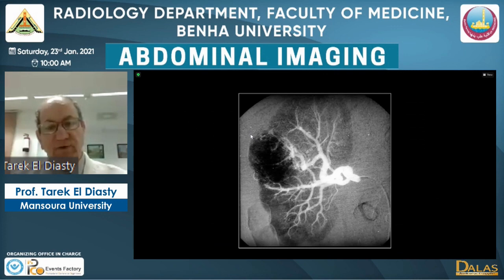And the other indication for selective renal angiography as a diagnostic tool is to make it preoperatively for the possibility of nephron-sparing surgery or partial nephrectomy for such a mid-zonal mass, because a mid-zonal mass is difficult to treat by partial nephrectomy. This patient had a previous radical nephrectomy for left renal carcinoma, so it is a solitary kidney, and the angiography gives a better vascular map before surgery, particularly if the CT angiography or MR angiography is equivocal.